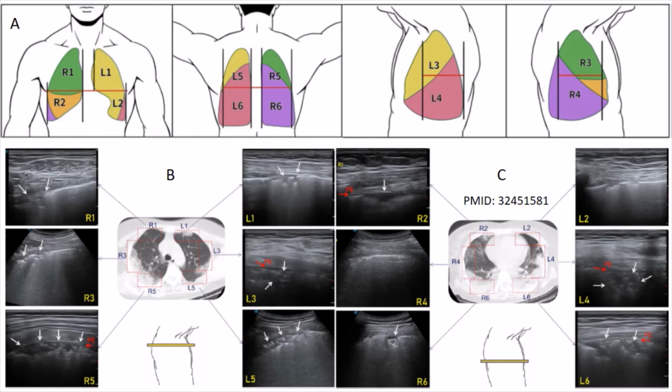The air bronchogram can be seen in large consolidations in L3, L5, and R5, and extremely little pleural effusion (red arrow) can be seen in L3 and R5. Chest CT shows patchy GGO with blurred margins in all regions, small patchy consolidations can be seen in R3 and R5, and no pleural effusion was observed.